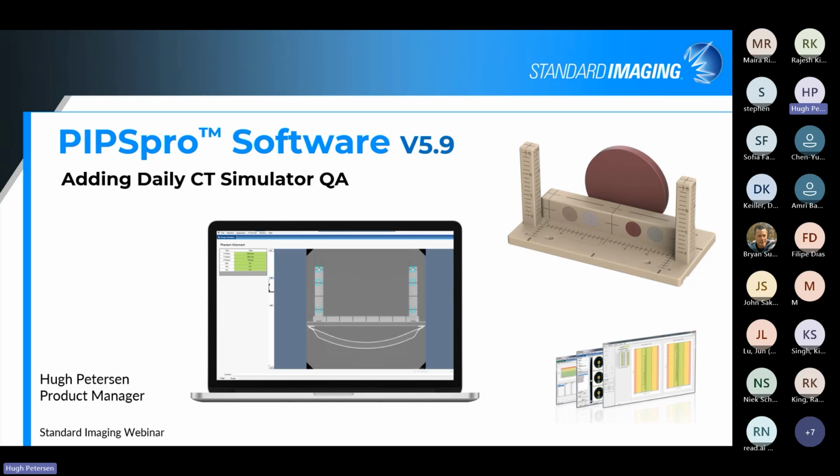The main one being, as you see here, adding daily CT simulator QA. But another feature we've added is, I guess it's not really a feature, but it's just an update. With the BrainLabs Exact Track, they had changed the import format of their images, and we've updated our software to be able to handle the new format of the import of the images for analysis of their Exact Track system.